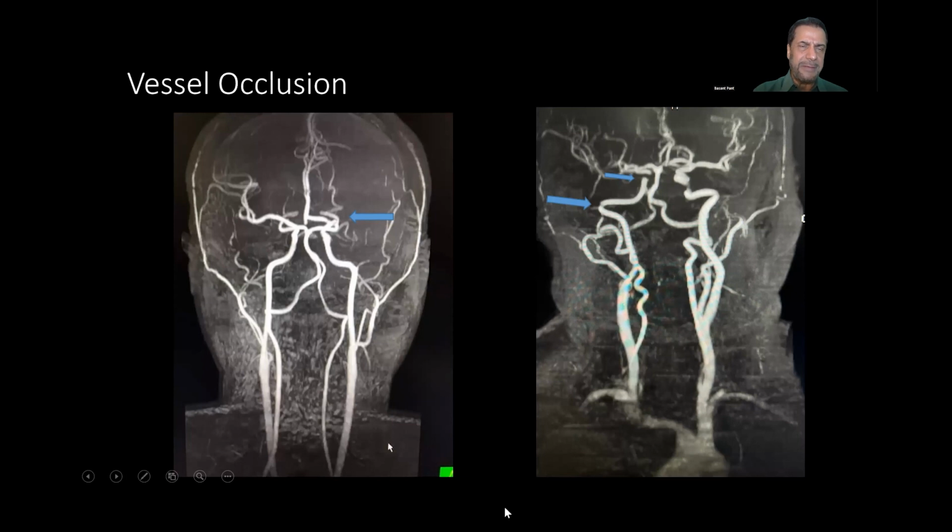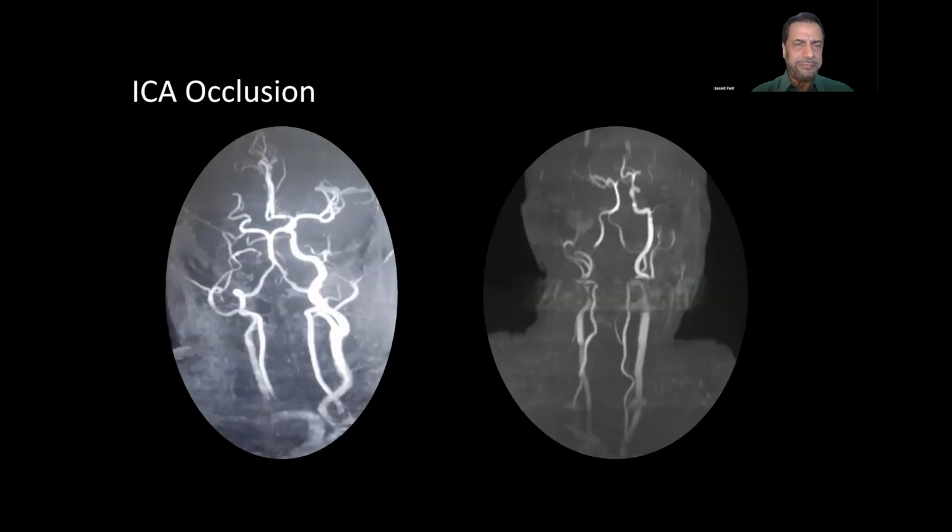In this image, you see that one of the middle cerebral arteries is completely occluded on one side, so you can suspect that the patient will have a large middle cerebral artery infarction. And this patient has multiple stenoses, but the middle cerebral artery is still visible, which means the patient may come to you with a stroke, TIA or RIND, many times small ischemic attacks.